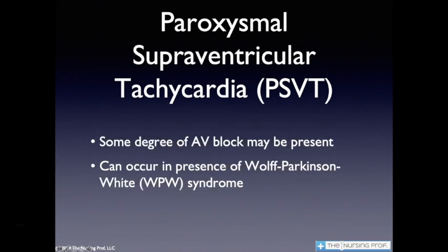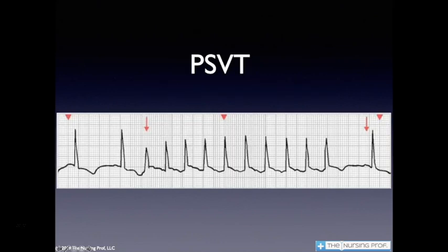There may be some degree of AV block, which causes this. We can also have the situation called Wolff-Parkinson-White syndrome, which is a type of PSVT that can happen in our patients as well. Treatment's a little bit different. So here's an example of PSVT.